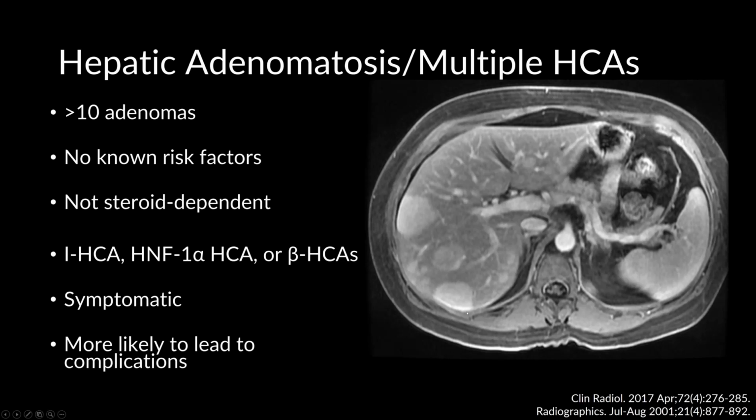And sometimes imaging does not have the resolution for locating all of the adenomas. Like in actuality, when you scroll through this study, you realize that there's a cluster of probably 10, 20 in this cluster here and here. There are also microscopic adenomas that obviously we can't identify on imaging.